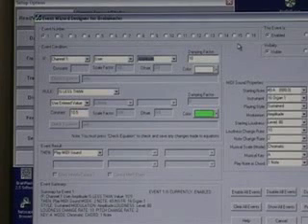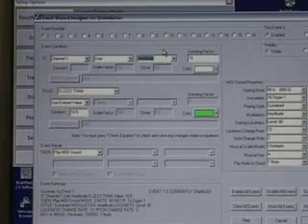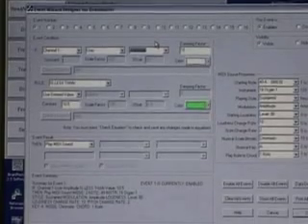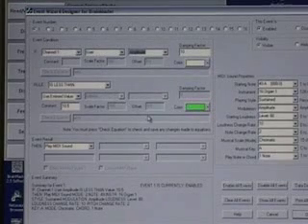As a new clinician, will I be using this feature in the Brainmaster software? Sure, you can use it immediately using built-in protocols. There are more than a dozen built-in capabilities to do all sorts of training. In addition, it's very easy to design your own protocols for any special need you might have once you've become accustomed to how the Event Wizard works.